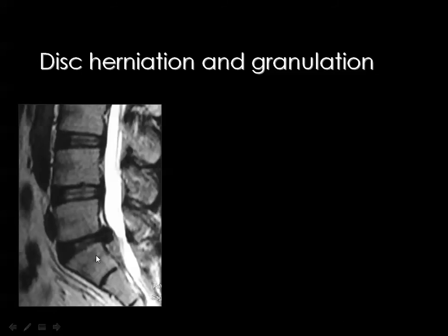And of course, you can easily appreciate the difference between the disc and the associated granulation tissue.